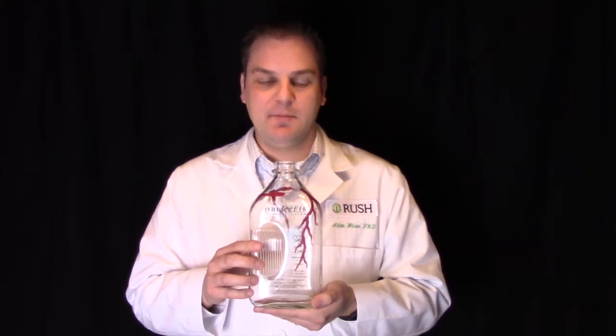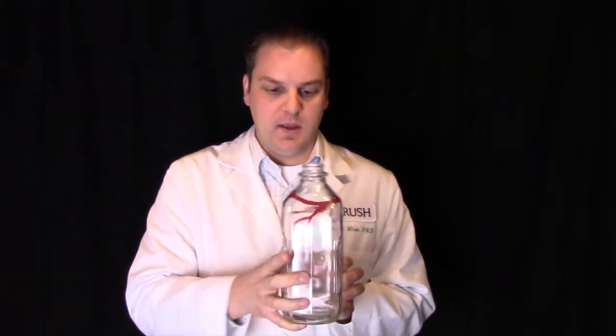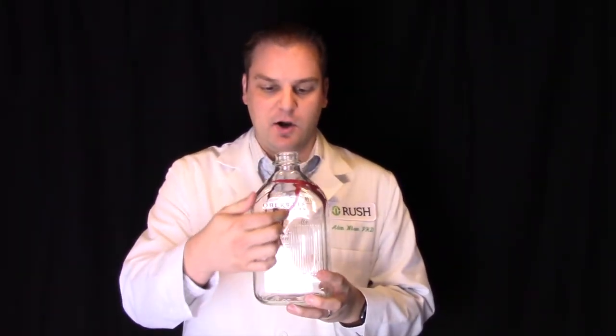To help you better understand the concepts of coronary angiography, I have painted coronary vessels on a milk bottle. This prop serves as a glass heart so that you can see how the X-ray beams pass through the heart to detect the coronary anatomy. On this glass heart, here is the right coronary artery and its branches. Along the right heart margin is the right marginal artery. And here along the posterior aspect of the heart is the posterior interventricular artery, also known as the posterior descending artery.